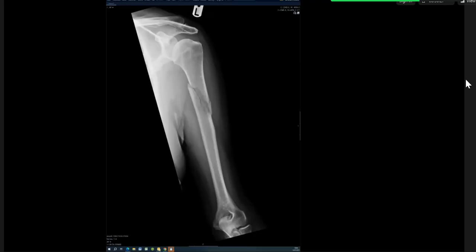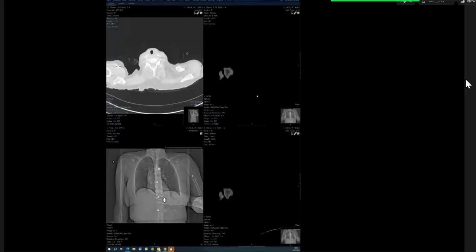So when you said this could be a metastatic deposit or it could be primary bone, are these your two differentials, bone tumor or metastatic tumor? Yes. Primary could be anywhere, or this could be the primary, because it could be a primary bone malignancy. So if this was a met, what do you need to request before you go down the biopsy route? I would do a CT thorax abdomen pelvis to evaluate for the primary.